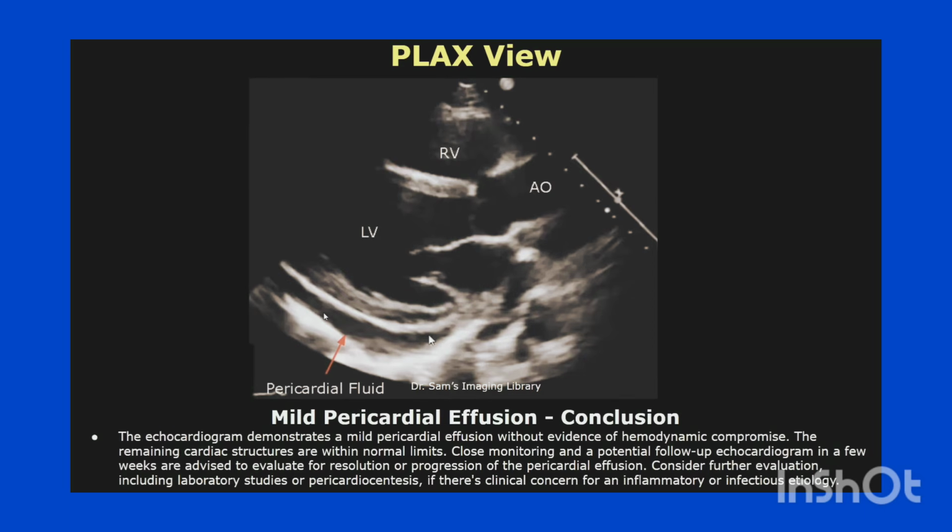This is the conclusion. The echocardiogram demonstrates a mild pericardial effusion without evidence of hemodynamic compromise. The remaining cardiac structures are within normal limits.